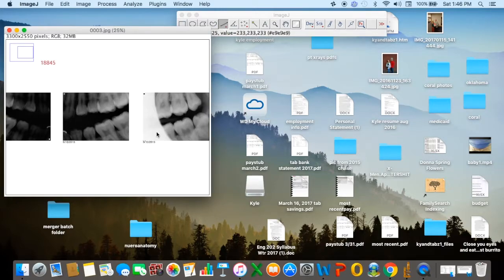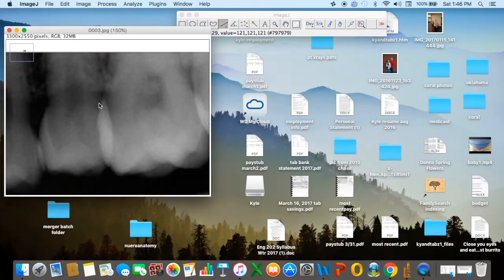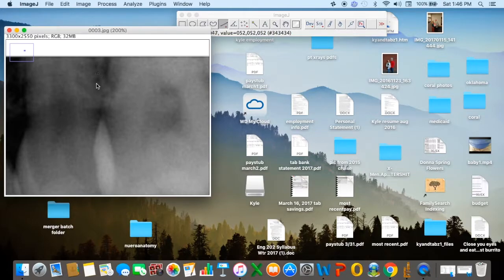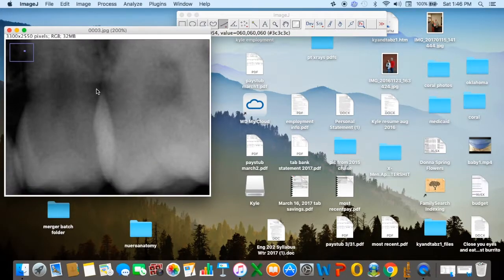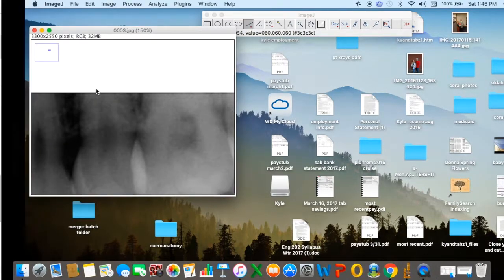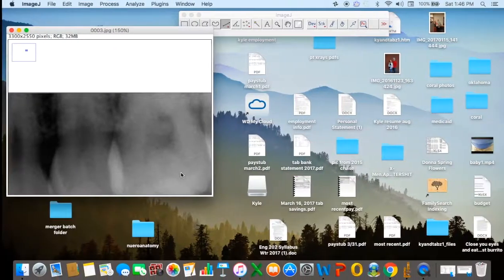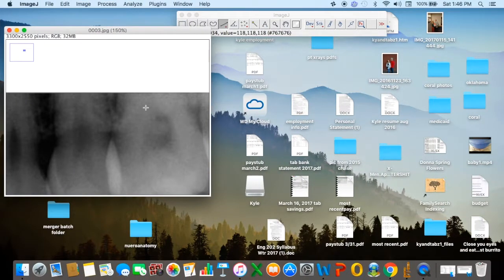In this case, it's been cut off. So instead of putting down a bad measurement, since we don't really get a clearly defined periodontal space right there, we're just going to leave that one blank. In order to mark that, we're just going to put the distal surface in this case. Okay, and we'll move on to the next tooth.